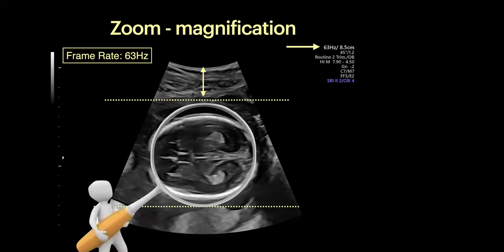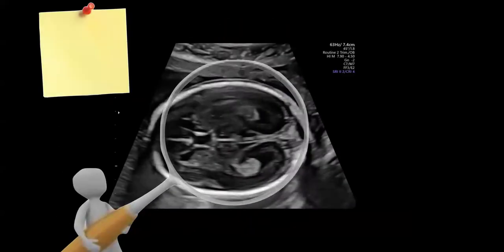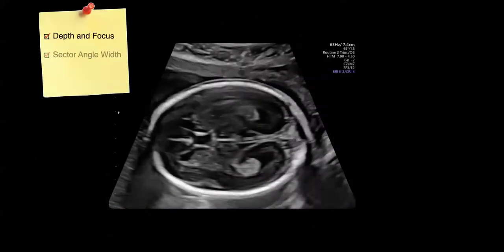And the reason why I really included this as part of my optimization talk was because when I first started in fetal imaging, and I worked closely with a fetal radiologist who happens to be my mentor, she's Dr. Dolores Pretorius. And the first thing she said to me, she was like, Michelle, why are you producing these postage stamp images? I can't really see anything, which is true because obviously it makes a big difference when you magnify, right, to your area of interest.